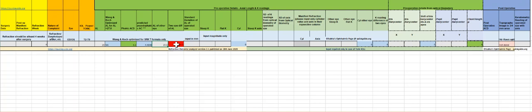So the two eye axial length difference, if this is the right eye, then the right eye axial length and the left eye axial length should be within 0.3 millimeters. So it gives you a red flag over here. So immediately the biometrician knows that there's something wrong and he can remeasure here.